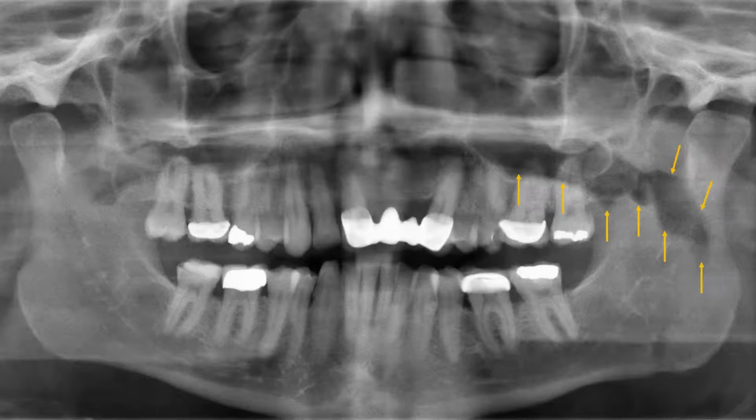In this example, the patient kept on moving the tongue at the last moment of the exposure. Because of the repeated movement, the dark area has irregular borders.